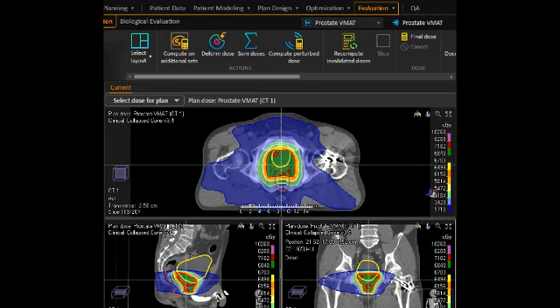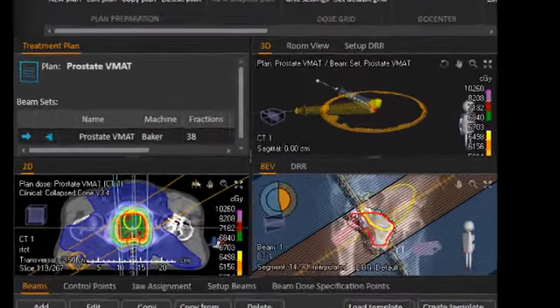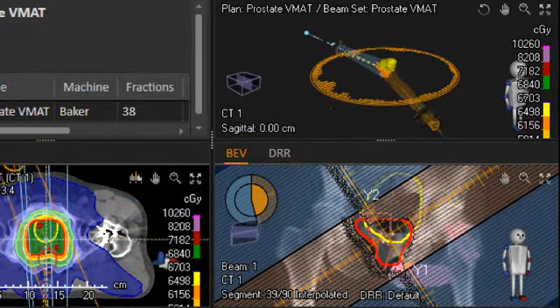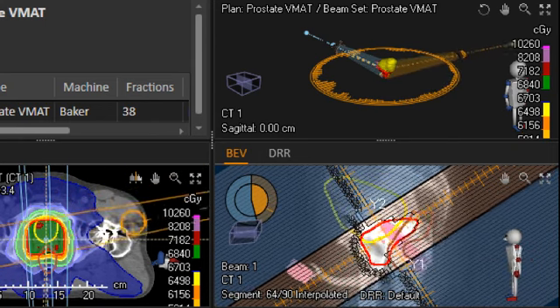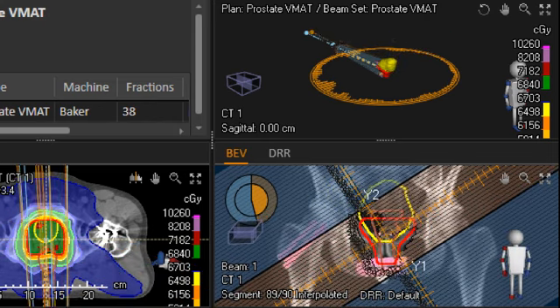All right. Okay, so we're going to start with this treatment plan. You've seen things like this before. And you want to verify that the actual plan as delivered on the patient is going to be delivered correctly. That's quality assurance. The problem here is the plan is pretty complex. As you can see here, you're rotating around the patient with this VMAT plan, and you can see the small segments as the arc goes around the patient. So you can't just visualize it on a patient like you did with a 3D conformal plan. So you have to have some alternative method.